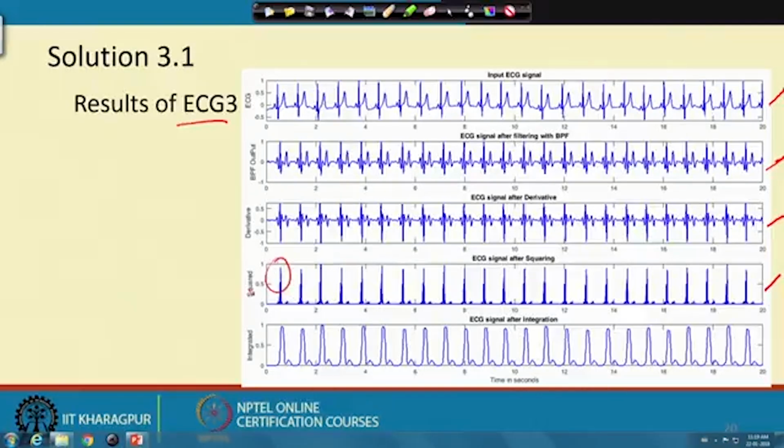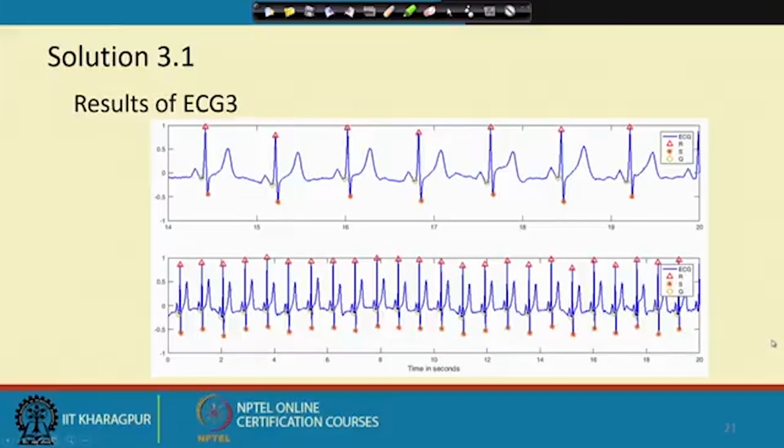So, we have passed it through an MA filter and we get pulse-like structures and clear separation between the small peaks and the high peaks. Here we get a very uniform view; if you look at the pulse heights, they are more or less the same. So, it is a very nice signal, and we could get all the QRS peaks here without any error. This is the marking we show, of how we could mark them.